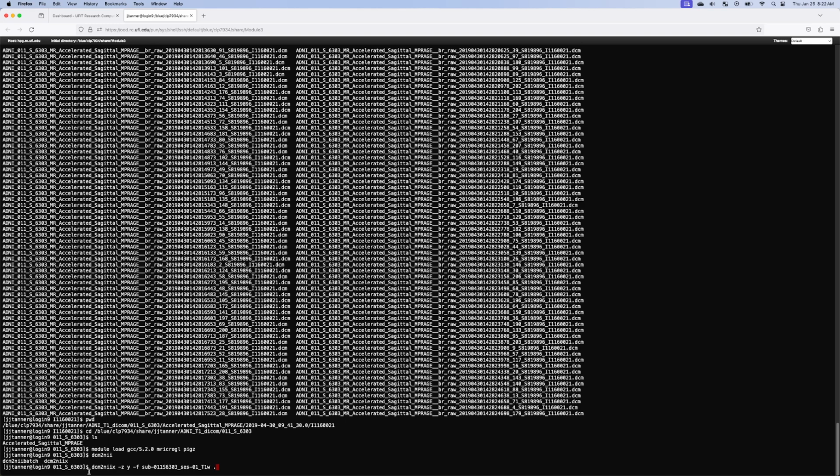So what this is going to do is use dcm2niix to convert the files in the current directory. And in this case, there's just one set of scans. There is this MPRAGE, which is a T1, and that's down a couple of directories, but the software can look down inside directories. So I'm going to convert these DICOM files, and it's going to save it as a NIfTI .gz file. That's the .gz comes from this z with a y after it. So yes, this is making a GZ file. And then we're going to save it out as a file name.